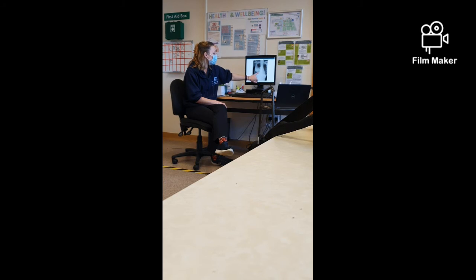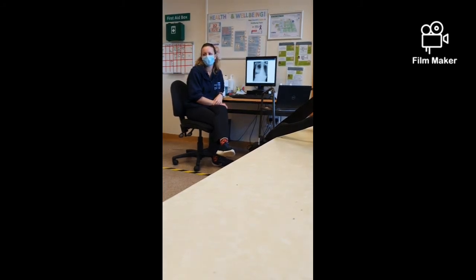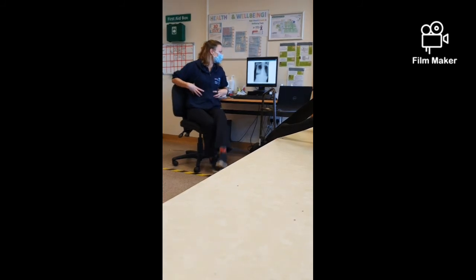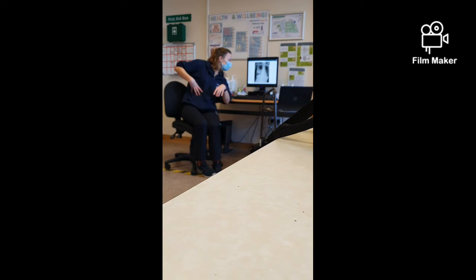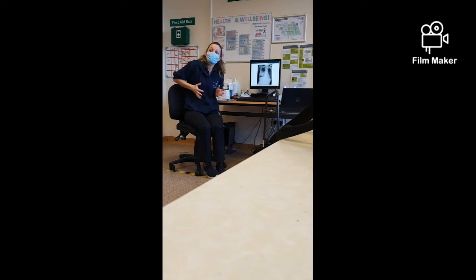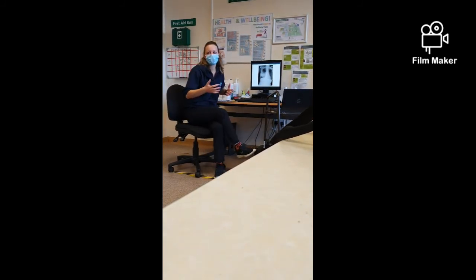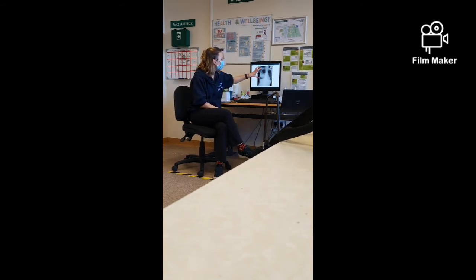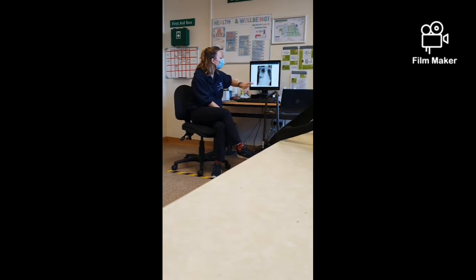Now, what potential reason could that be? If you're thinking about the orientation of the chest X-ray, they might be lying on their side potentially. Yeah, what we've got to consider is that it could be to do with the position that they're in. It looks very much like the semi-erect. They're leaning over to the left a little bit. So if the chest X-ray is taken at that angle, actually the heart is going to look like it's shifted over, but I don't think it has, because we've not got a deviated trachea, or anything else that suggests that. So we just bear in mind that it could be to do with the position the X-ray is taken.